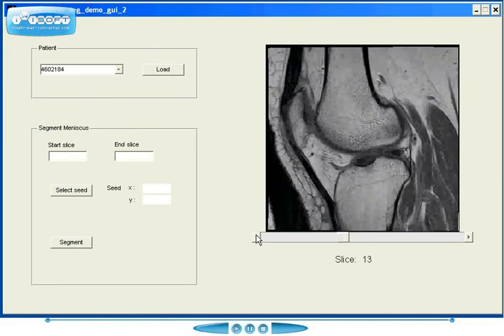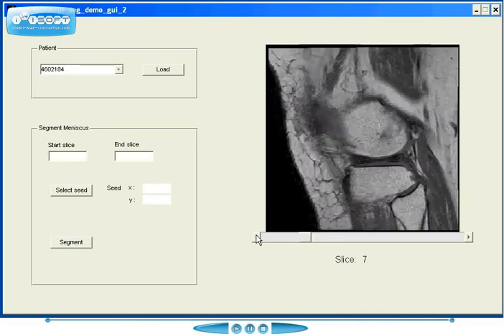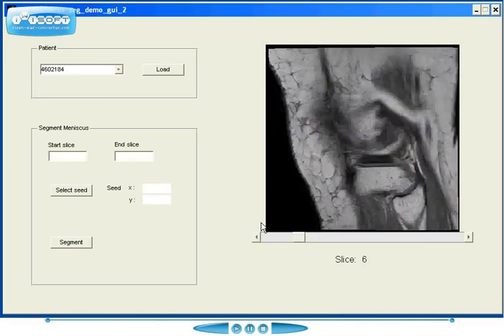And this segmentation method was developed to enhance speed and consistency as opposed to manual segmentations. Manual segmentations are prone to inter and intra-reader variability, which can be reduced using computer-assisted algorithms because of their consistency.